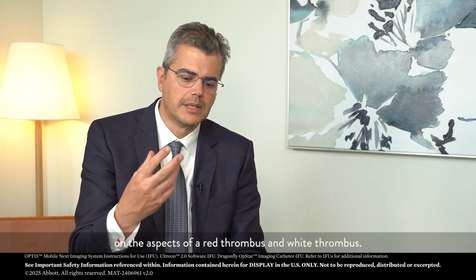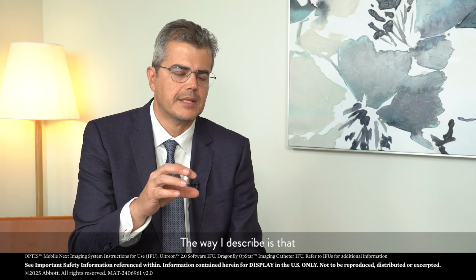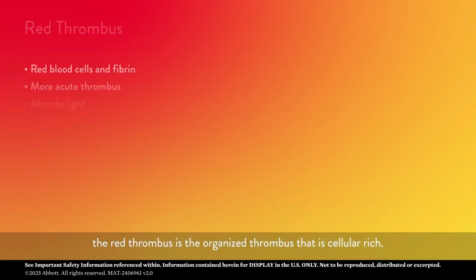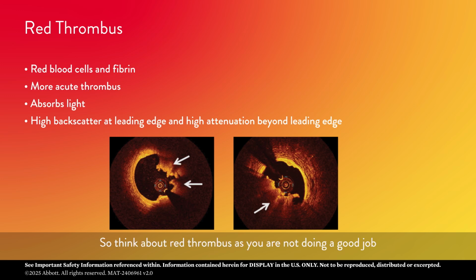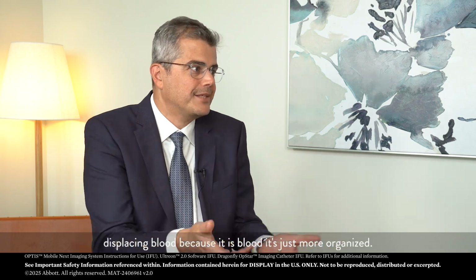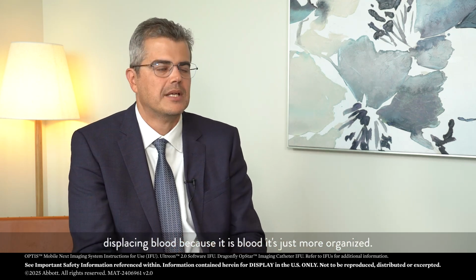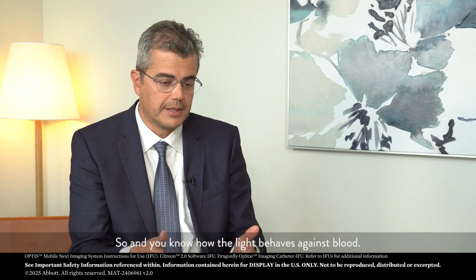But back to your question on the aspects of a red thrombus and white thrombus, the way I describe is that the red thrombus is the organized thrombus that is cellular rich. So think about red thrombus as you are not doing a good job displacing blood, because it is blood. It's just more organized. And you know how the light behaves against blood, it attenuates.